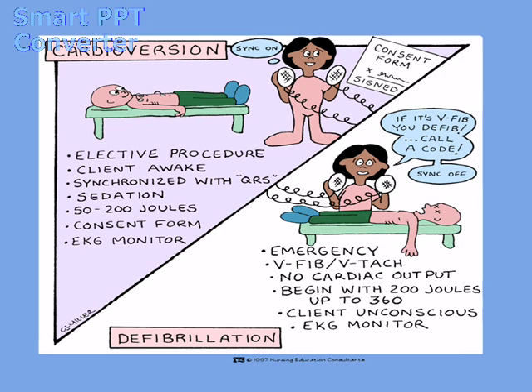We're going to monitor the patient in a lead that gives us an upright QRS complex so that we can have a really good look at what the ventricle's doing, because we're going to sync with that QRS complex, synchronize with it.